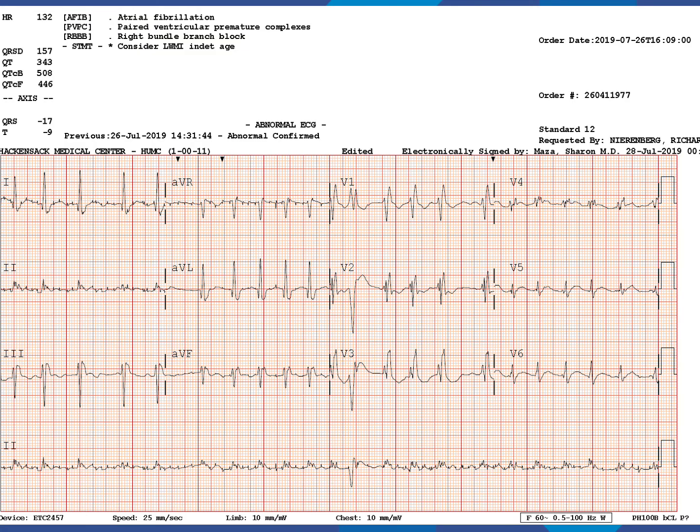This is a patient I saw very recently, presented with acute onset of dyspnea. There's a rapid rate, there's an S in 1, some T-wave changes in 3, there's a right bundle branch block with T-wave inversion in V1. The patient was placed on heparin before a CT scan, and that revealed a massive pulmonary saddle embolism. He went to the catheter lab for catheter-directed TPA, and he did well.